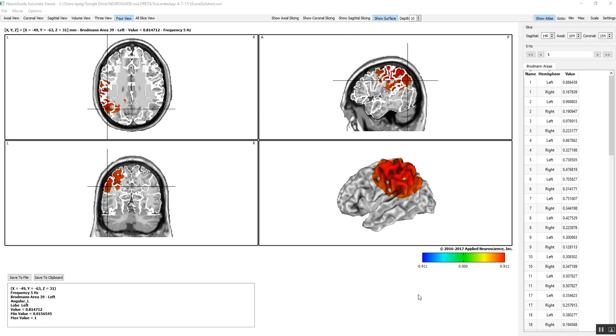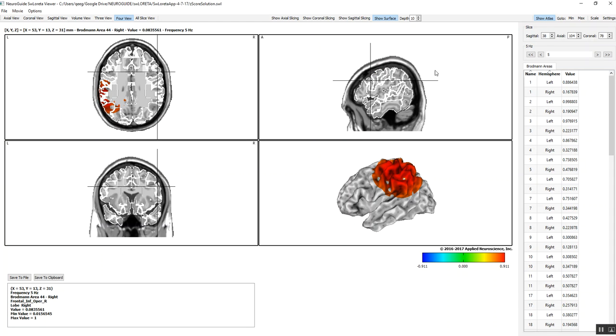As one can see here immediately, this is a realistic brain MRI. One can remove the Brodmann areas and just look at the MRI rather than with the Key Institute. It was an average of 305 normal individuals' MRIs, and it was very blurred, whereas you can see there's great detail in this individual MRI, and we also can activate Brodmann areas.